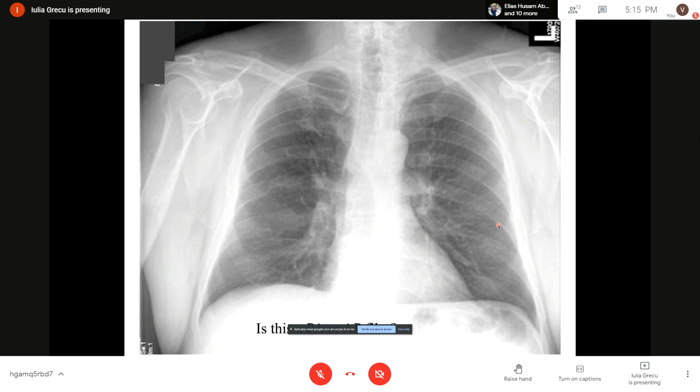When we do a classic and standard X-ray in PA projection, we will have the scapulas projected out of the pulmonary lucencies. We will have no shadowing given by them on the lungs.